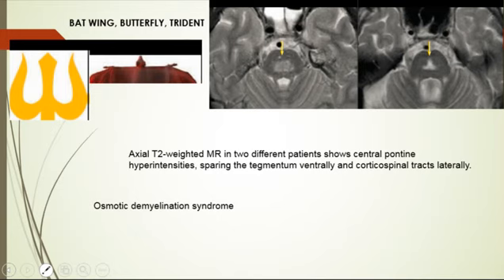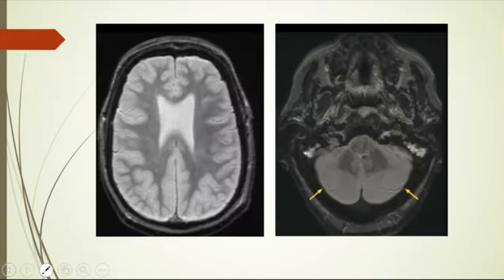Good. So, what do you see here? What do we have here? This is an adult brain, T2, axial, at the level of the cerebral hemisphere and at the level of the cerebellum. And there are two arrows on the cerebellum. What do you think is going on?